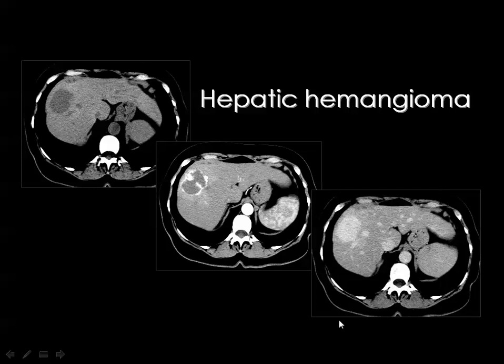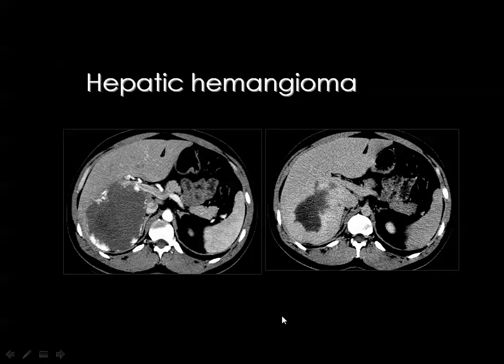One of the major characters of the hemangioma is that whenever you wait for some time, let us say 2 or 3 minutes, then you get diffusion of contrast filling the whole hemangioma, which is known as the iris sign. Like the iris of the eye, it is a concentric centripetal diffusion of contrast media inside the hemangioma.